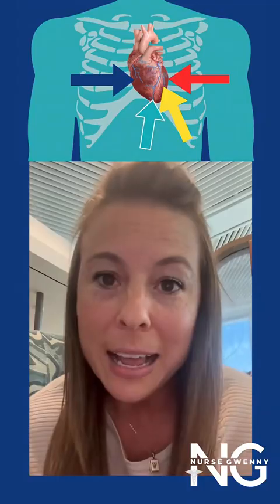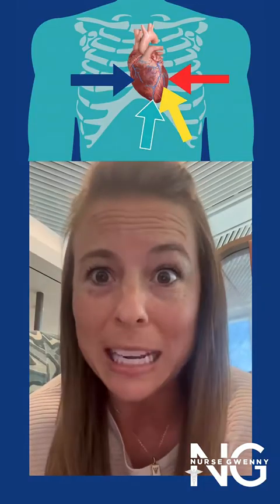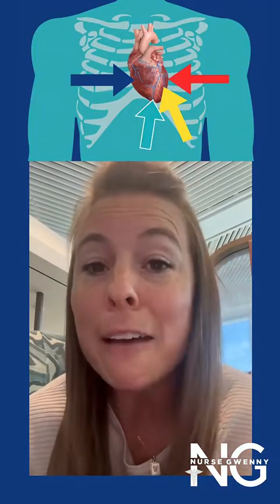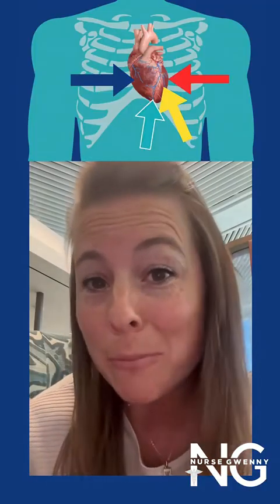There's much more to it, like if we're talking about modified Sgarbossa or looking at the South African flag sign. This is the very basics of how to read an EKG, and I hope that helps you out.